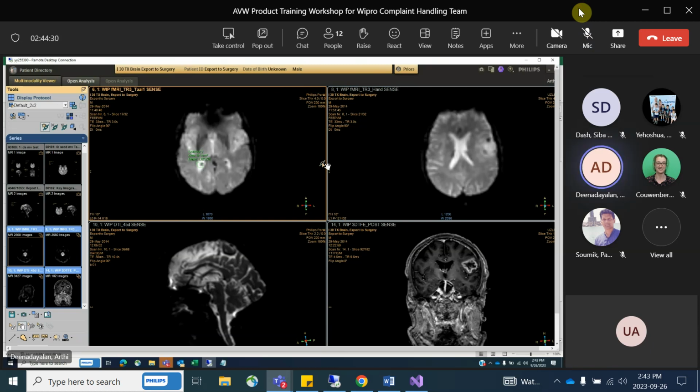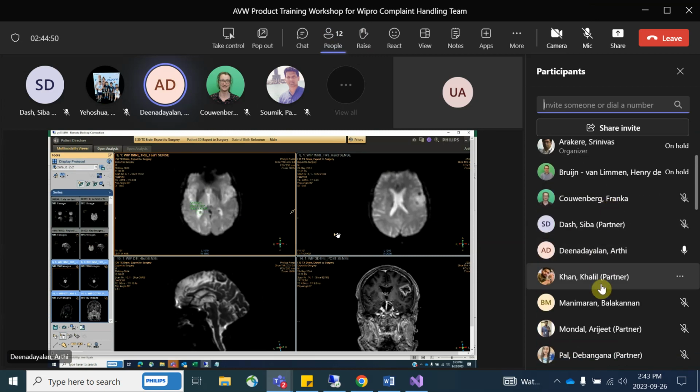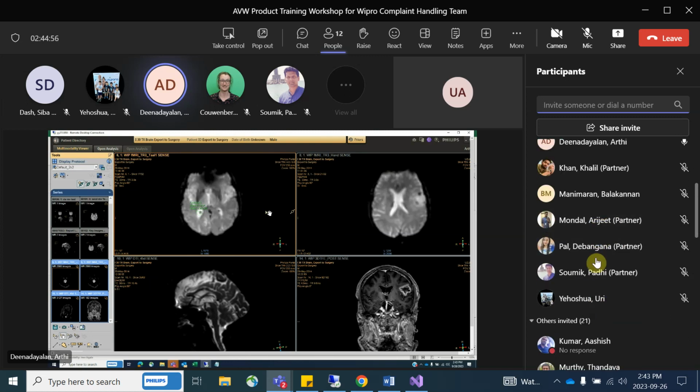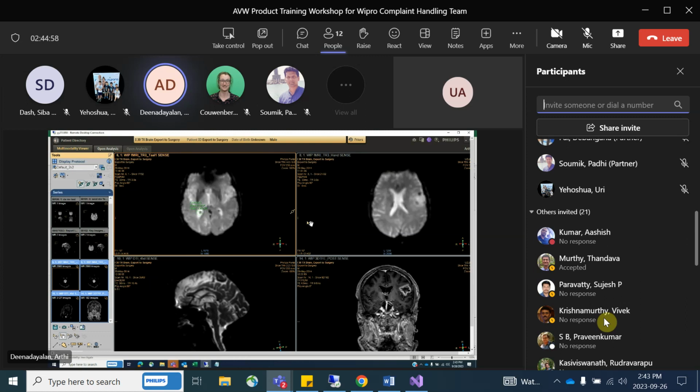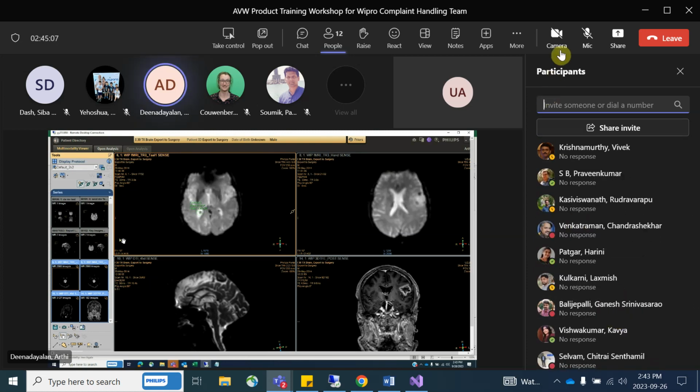So any other questions as of now? Okay, so let me tell you about the MR applications then. As I told you, this is just a gist of MMV to play around. How do you view it? What are the basic operations that you can do? Once you have hands-on experience, I think you will get to know many other things. Usman, any other queries you have in MMV? No, okay, fine.